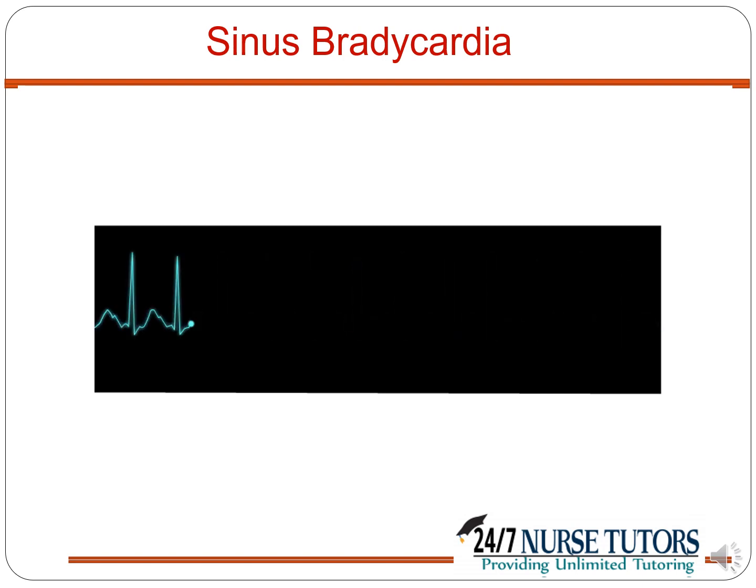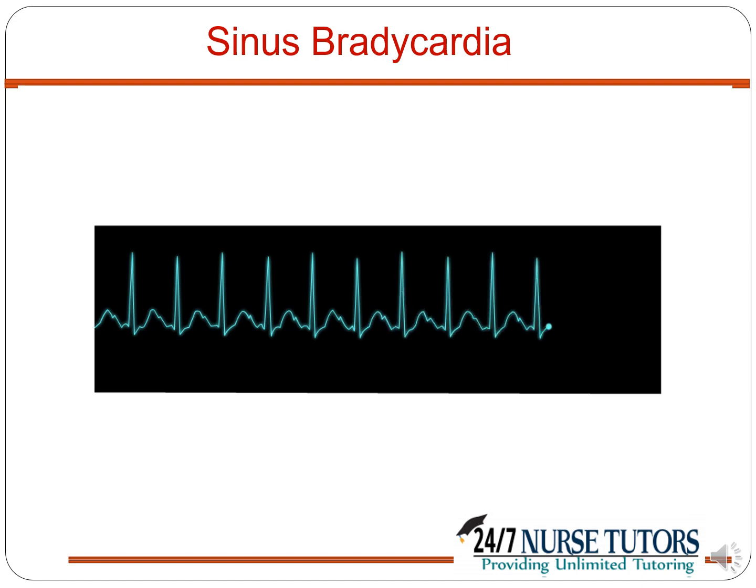Bradycardia. Everything is normal except the heart rate is less than 50. Again, some may say 60.